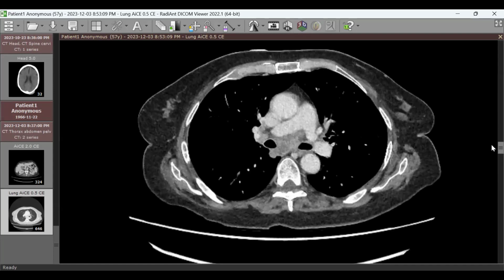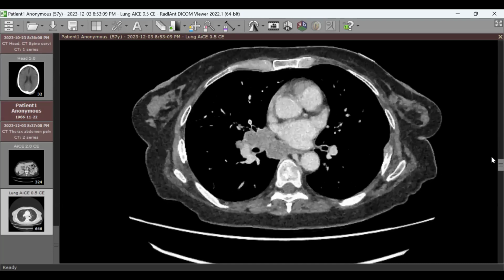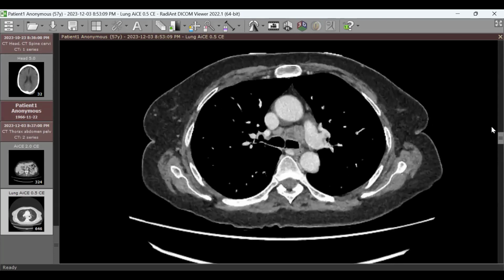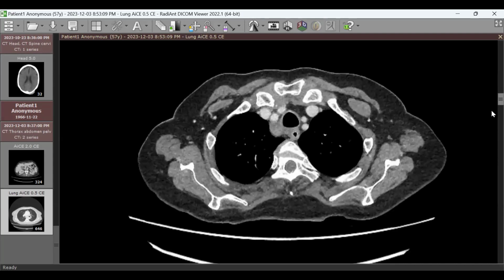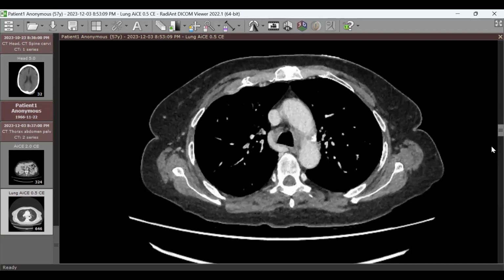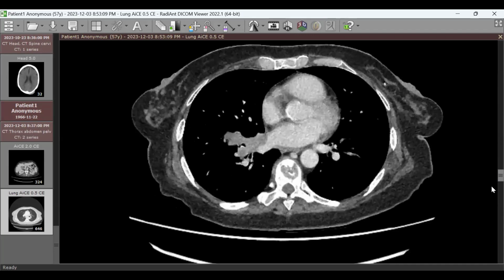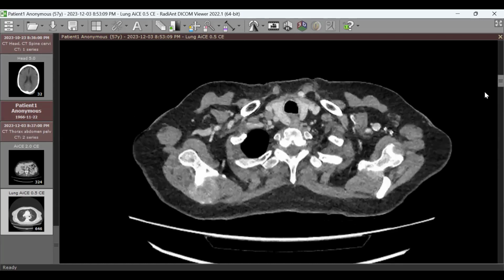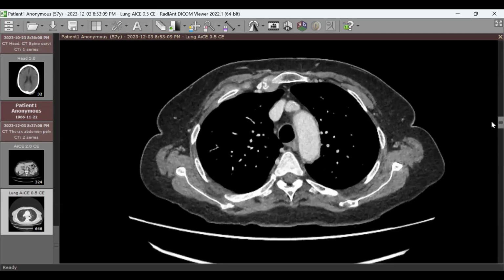And N3 is contralateral, considered either way. If there is any contralateral lymph node, whether in hilar position or mediastinal or supraclavicular on the other side, that's N3. So we have here an upper right paratracheal, a lower left paratracheal, subcarinal, and also this one, the extension. Okay, good. And now we saw different rib lesions, right? Rib lesion, vertebral lesion. Great.